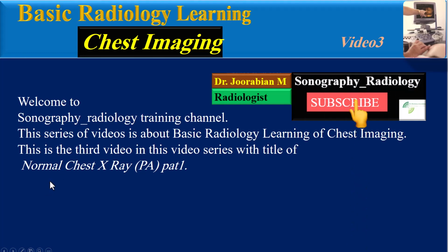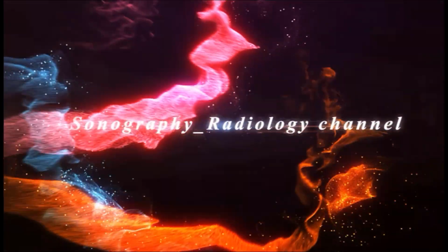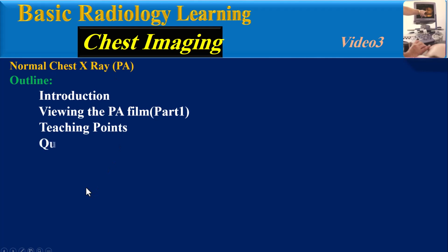This series of videos is about basic radiology learning of chest imaging. This is the third video in this video series with the title Normal Chest X-ray PA Part 1. The outline of this presentation includes introduction, viewing the PA film Part 1, teaching points, and a final quiz.